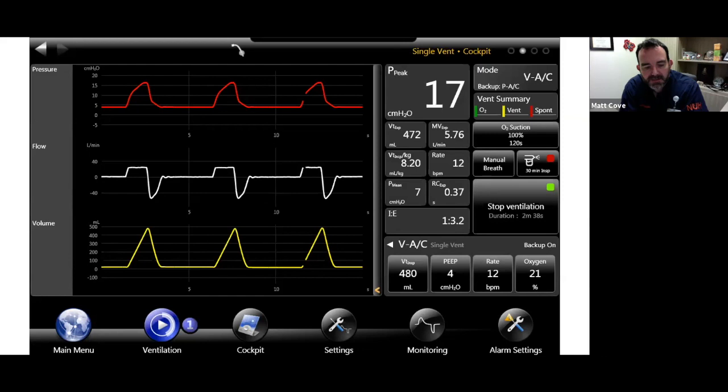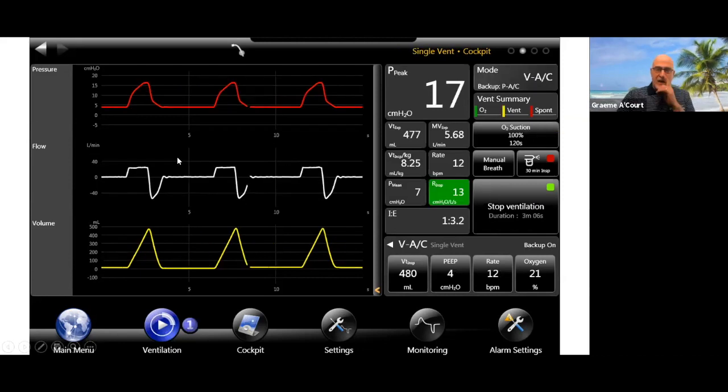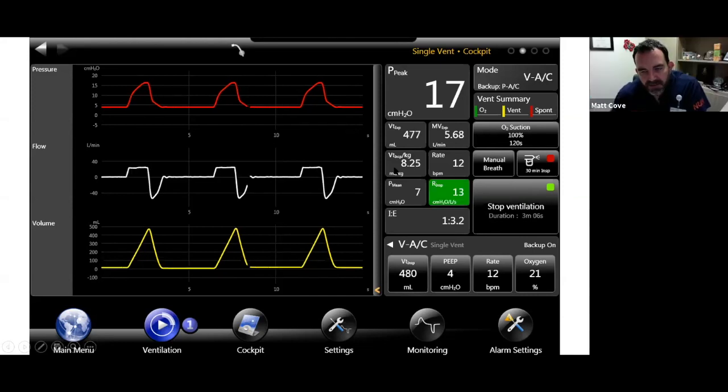Yeah. So, okay, the same one over here again, just using dynamic compliance. And this one over here, I've changed around again. I've found out that in the Bellavista, I can actually have resistance as well. I like that. Things that we can actually show, the ventilator can be made up to be what you want to measure. I suppose they can also do either inspiratory resistance or expiratory resistance. This is calculated again? Yeah.